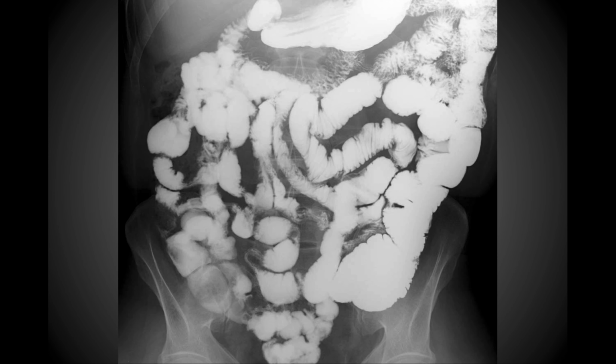So looking at this image, again, this is showing you that small bowel that we looked at previously. And so this is a good image to work on trying to differentiate between the small intestine. So again, you can see jejunum up here, clearly some of the ileum down here, and then the cecum over here. You can also see the stomach, where it's transitioning into the duodenum and then moving into the jejunum ultimately.